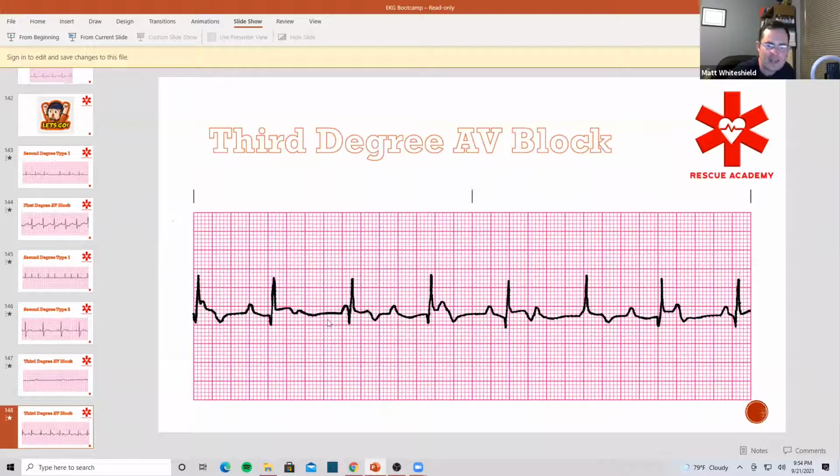This one, there's no delay at all. Then look at this one. This one's massive, way bigger than the last two. Then it gets more narrow. It's all over the place. There's nothing in this EKG that's talking in like a normal pattern other than these QRSs talking to each other, and the P waves, believe it or not, are on cue. All right. The P waves are doing their own thing. The QRSs are doing their own thing. That's what's going on with a third degree block.